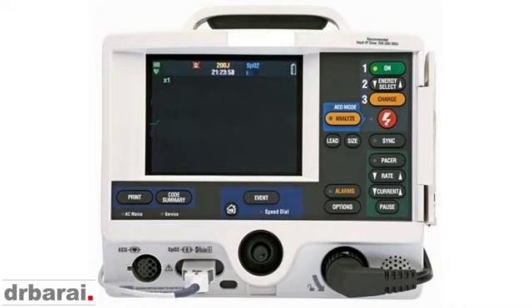Now, what is happening here? If you carefully look at it, this is sinus rhythm, no doubt about that. There is a P wave followed by a QRS complex, P wave followed by a QRS complex, P wave followed by a QRS complex. However, the PR interval, from the beginning of the P wave to the beginning of the QRS complex, is a bit wide. It is more than 200 milliseconds. So this is a first degree heart block.